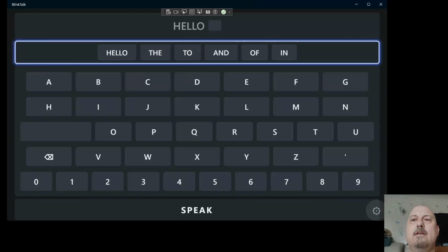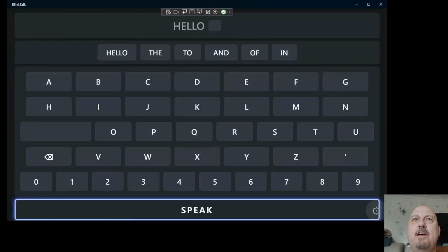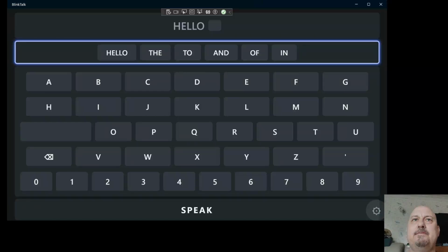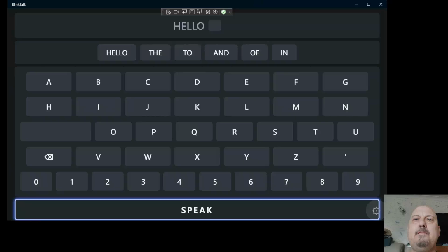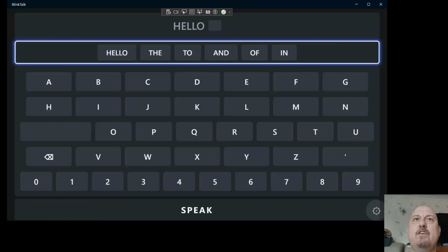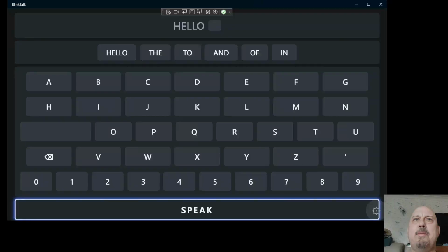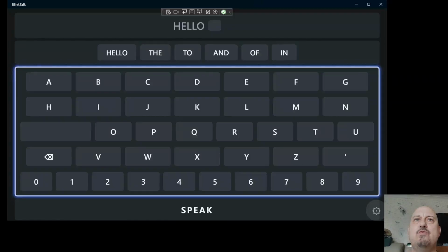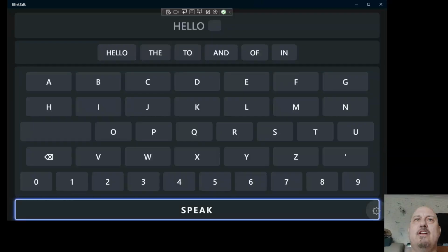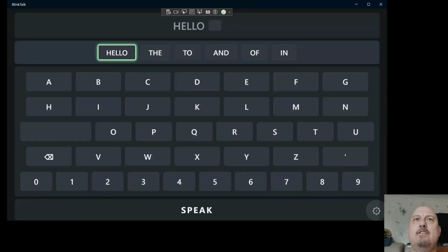Hello. It said hello. So just to make it a little bit more interesting, I'm going to say hello, how are you? So notice at the top there's some words. The more I use it, the more it learns about me and it gets better at predicting which words I'm going to say next. So far all it knows about me is I like to say the word hello. So I'm going to go into there. Oops, I missed it, but don't worry, it'll cycle back to the first one.